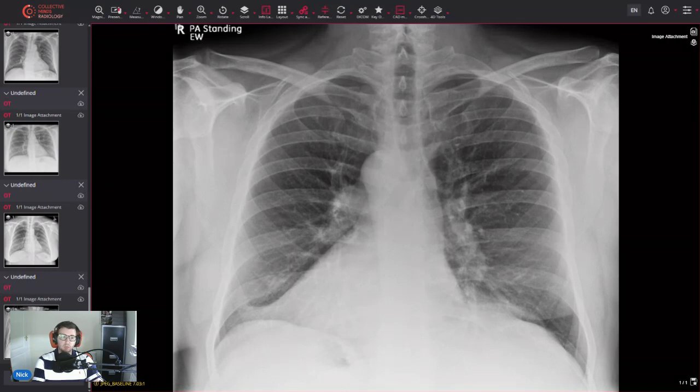So essentially the image will be flipped. So we've got to make sure when we're reviewing these x-rays that this has been done in the correct orientation, that it's not due to a processing error, that it is actually dextrocardia or situs inversus that is anatomical rather than incorrect post-processing. So we've just got to make sure of that before we verify the report. If it's the first image, you can check with the radiographers. If it's one of several, you can obviously check with previous imaging to confirm.